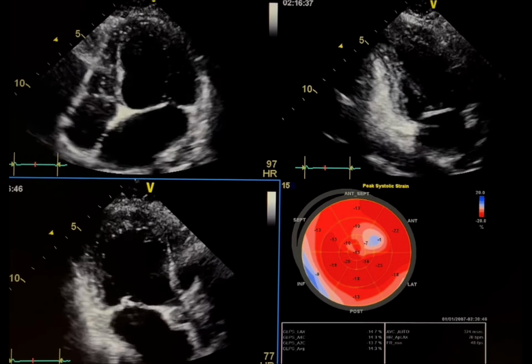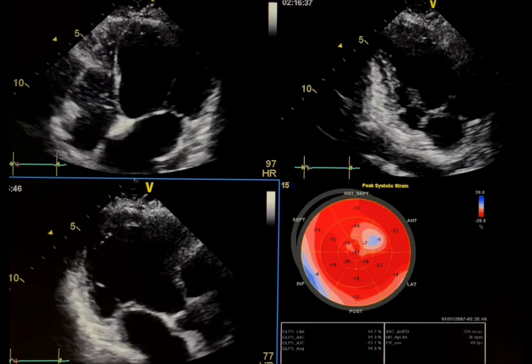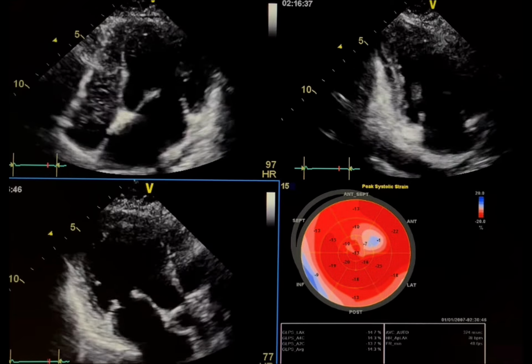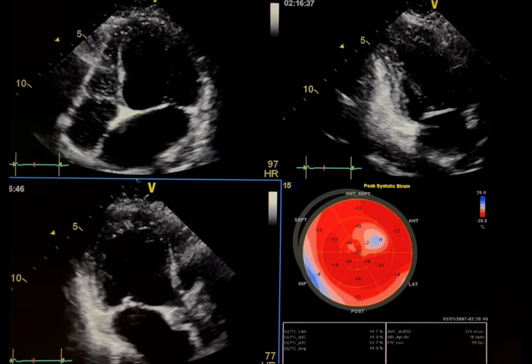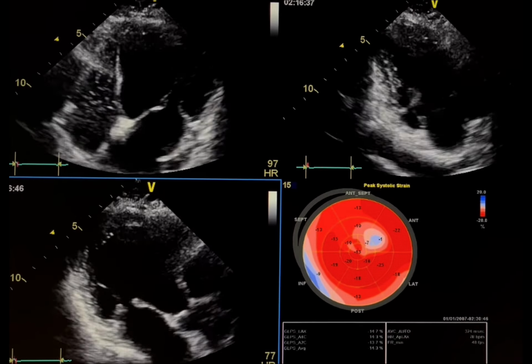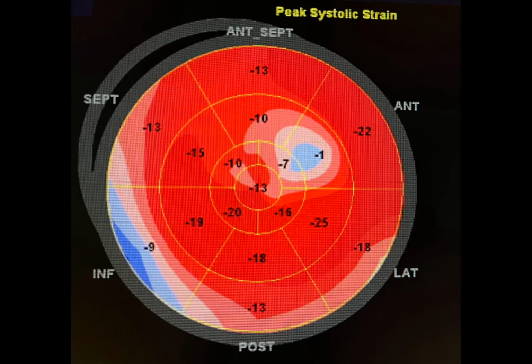Significant myocardial dysfunction along with a decrease in GLS is seen in this patient. It can be due to radiation-induced cardiomyopathy. While rheumatic heart disease can also cause significant myocardial dysfunction, this typically occurs in the end stage of the disease. LV dysfunction in radiation-related heart disease is primarily due to myocardial fibrosis or microvascular damage caused by radiation.